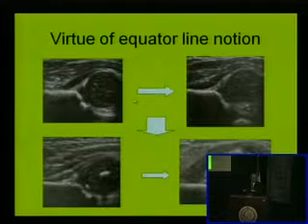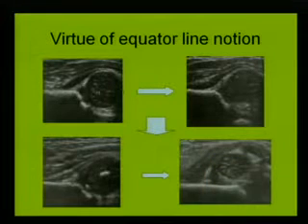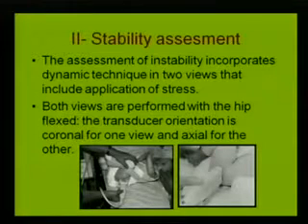With the value of this, you can grade and you can easily recognize the state of the joint, whether subluxated or dislocated. Here is normal, where the iliac wing, you can see, is covering 50%. The degree of coverage here is less, maybe 30%. Here it is even less, maybe 25%. Here there is no coverage at all. So the equator line is also another added point to the different Graf angles. All this we have described is the morphology of the joint by Graf angle or equator sign.